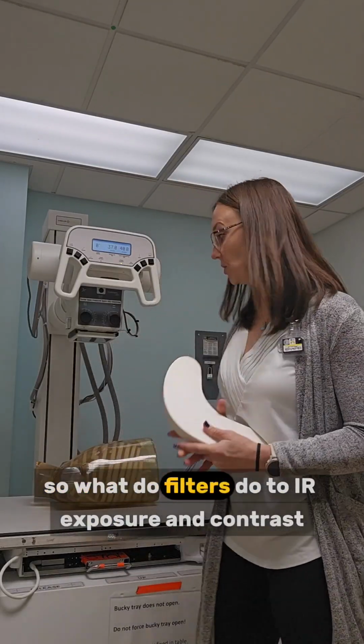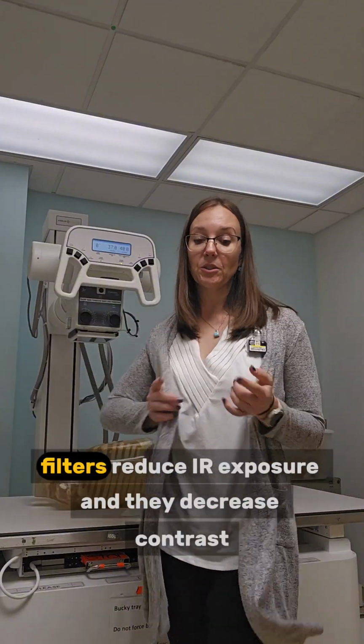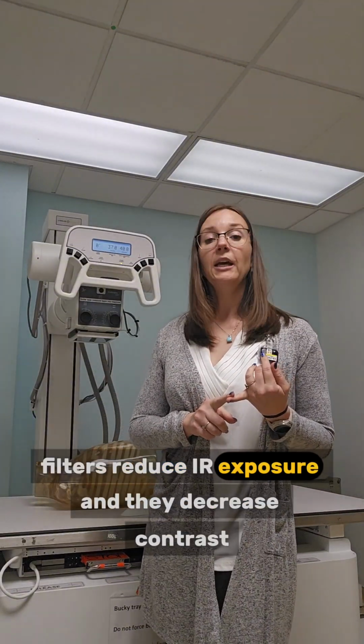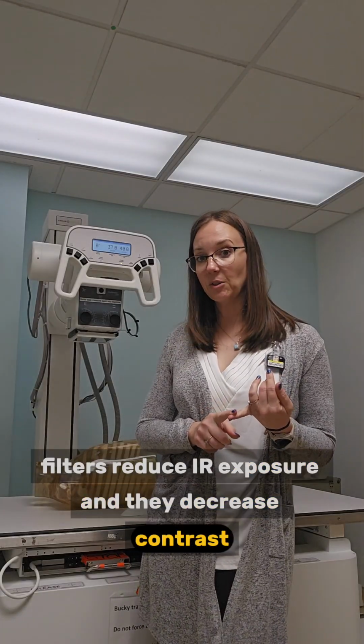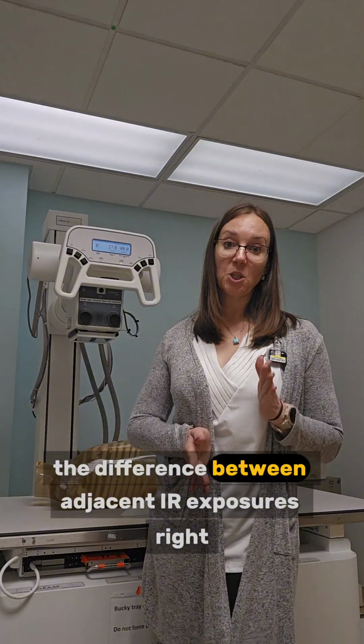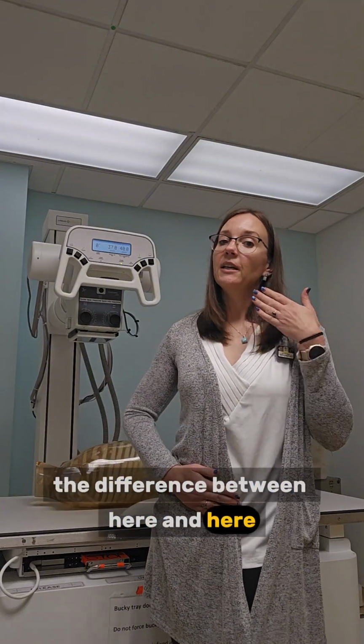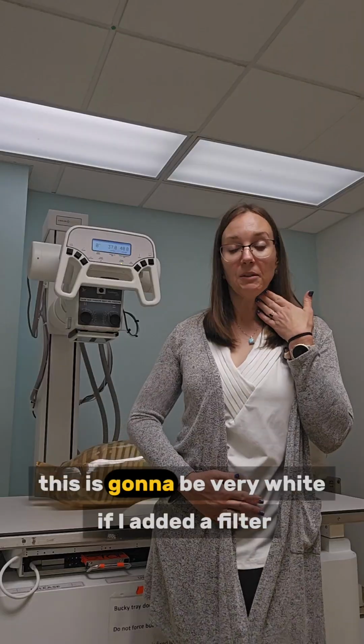So what do filters do to IR exposure and contrast? This is the most important part. Filters reduce IR exposure, and they decrease contrast. Remember what your definition of contrast is: the difference between adjacent IR exposures, right? The difference between here and here, this is going to be very black, this is going to be very white.